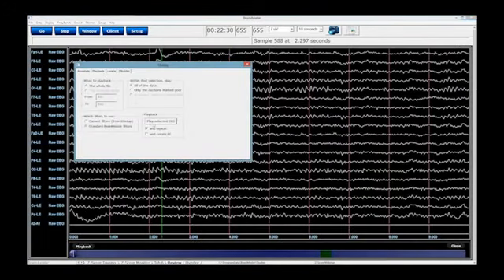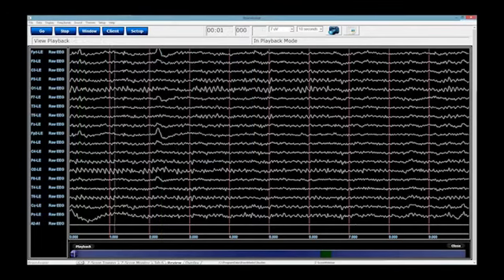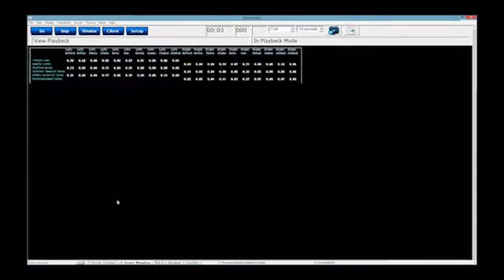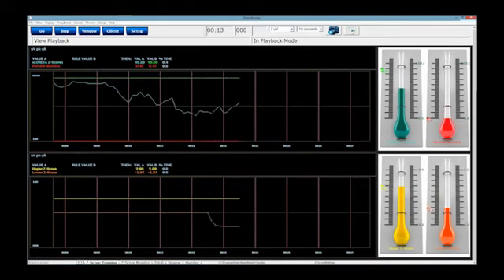Double click, playback, play selected, and repeat. Whatever, it's playing the whole thing, that's okay. So now here we're going to see our Z-scores coming in and rolling. Now here we go. This screen is exactly the same as what you're used to. You got your upper threshold, you got your lower threshold.